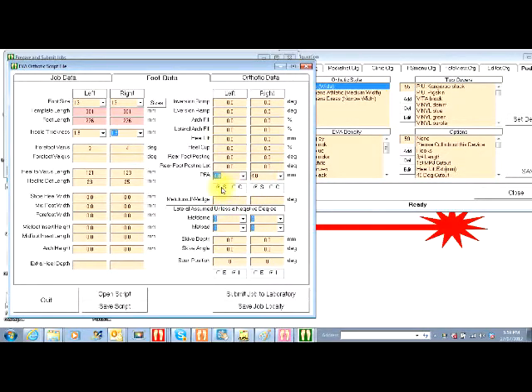So you select the size of PFA, and we have two different options. Some people like us just to do a straight cut into it to the depth for the PFA, and others prefer us to curve it around the front. A metatarsal wedge, we usually always assume lateral, because it's used 99 times out of 100. If the foot's got a valgus, they're walking off the outside of the foot and they want to correct their gait, that's when they tell us to wedge the front of the foot.